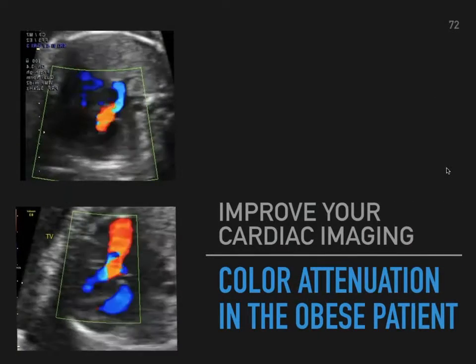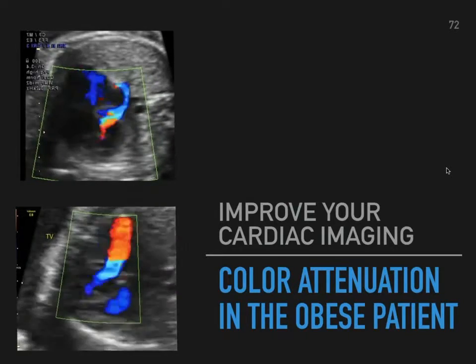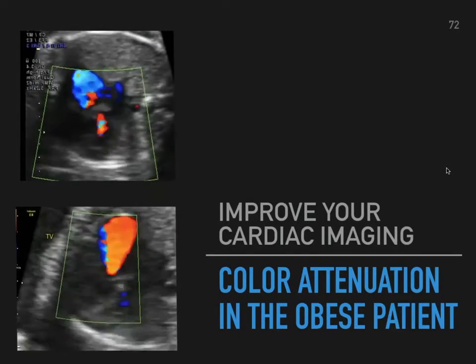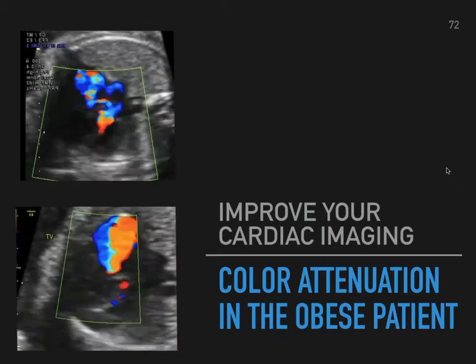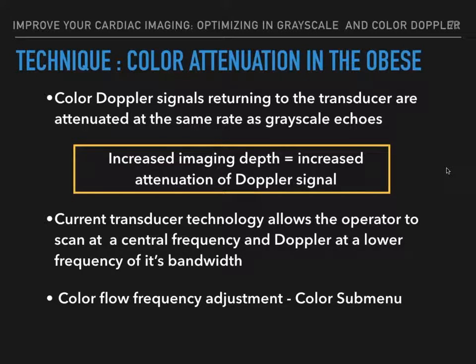Another excellent technique with color Doppler, with tips on attenuation in the obese patient. So color Doppler, as we all know, the signals returning to the transducer are attenuated at the same rate as grayscale echoes. So increased imaging depth is actually equal to the increased attenuation of Doppler signal.